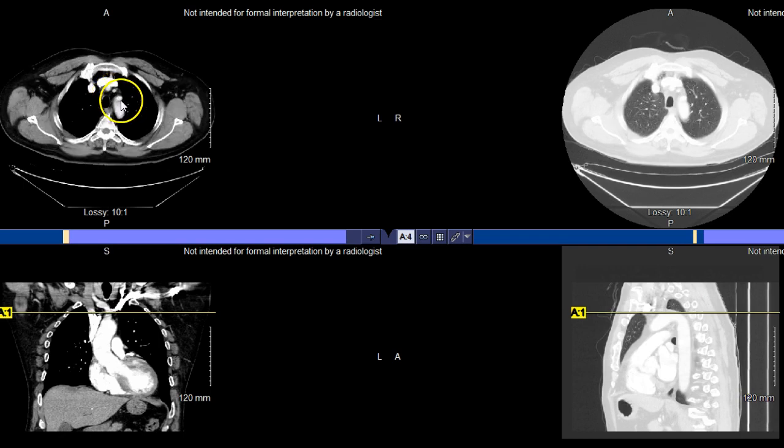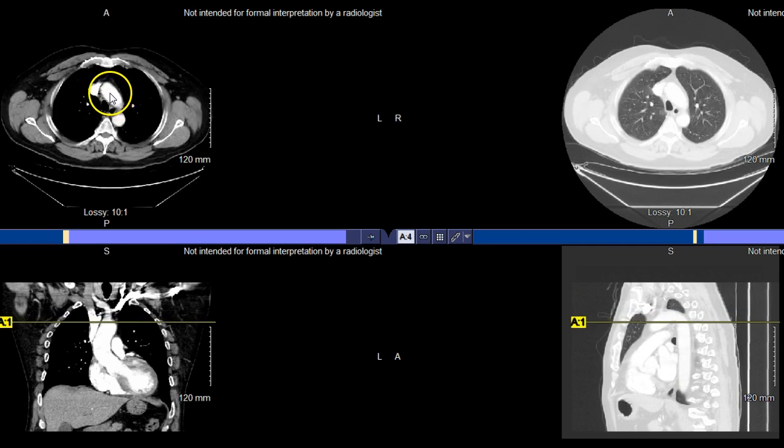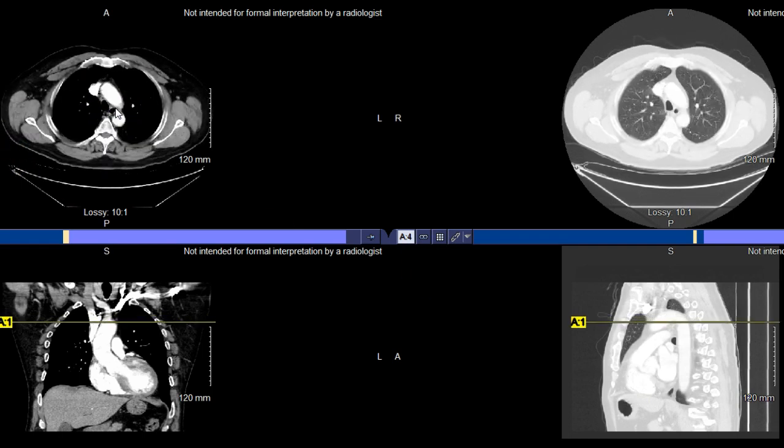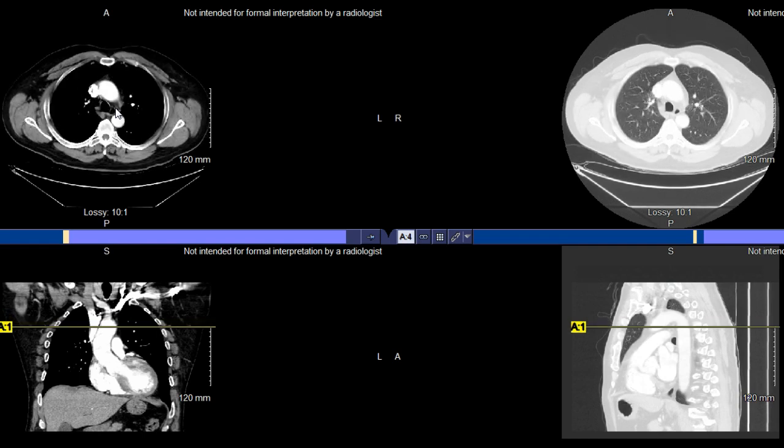You still should be able to see them pretty clear, and you can start to see the structure of the aortic arch then forming as we go more inferior into the body. So there's basically the true aortic arch, and you can see respectively kind of where we're at on this data set here as well. But looking at that, you can see now, all right, so that was the aortic arch, but now you can see how they're separated as we go more inferior.